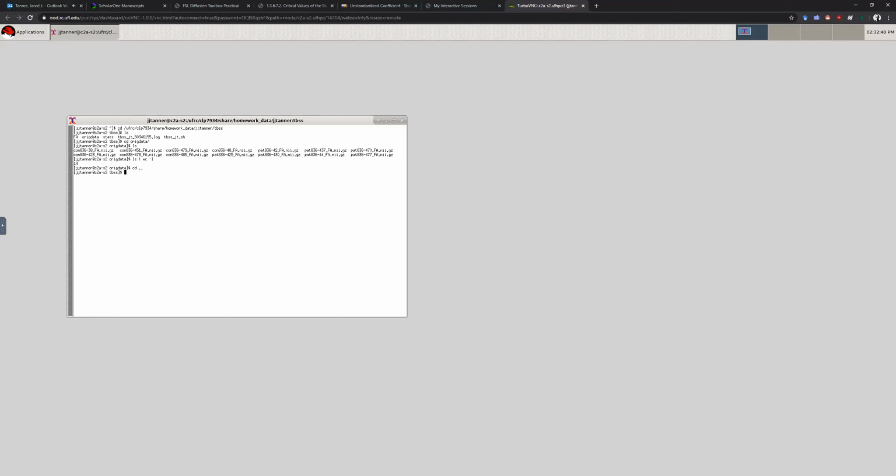Really what we're interested in is the stats folder. So I'm going to go into the stats folder. We can type ls, and we can see a number of files in there, all FA skeletonized. We have our con versus pat.con. So I'm going to run a command called cat, and that will just print the contents of that text file so we can see what they are.